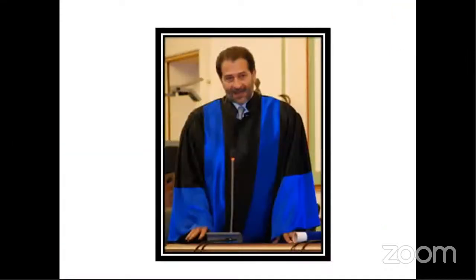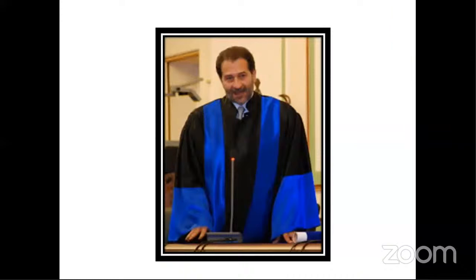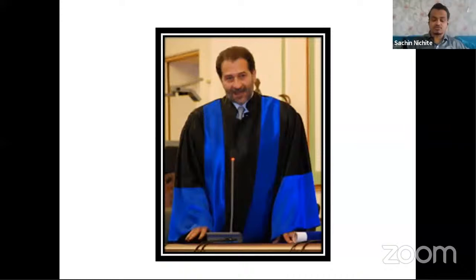This person has revolutionized NT scan. Prior to Kypros, NT scan was done. But what this person has done is he has researched particular criteria. So there is no question about why we should do NT scan in this particular section only, why these criteria have to be met.